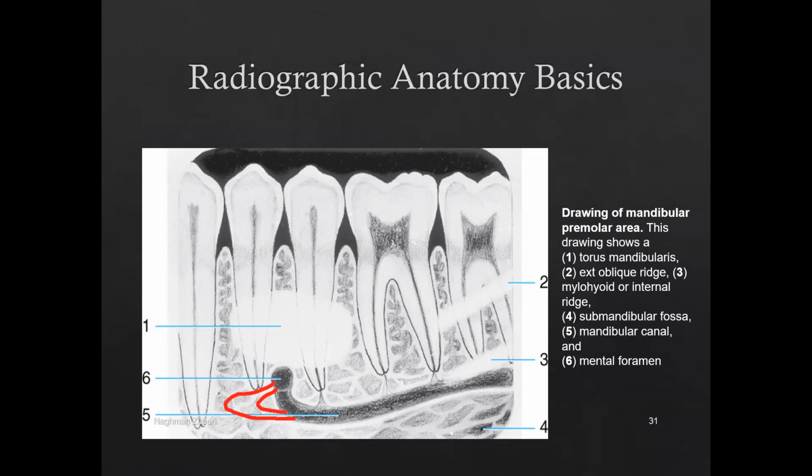So in case they ask you about the designing or placement of the implant, keep in mind that we will keep at least 5 millimeter anterior to this anterior loop. If it is straightforward, then 5 millimeter from the anterior border of the mental foramen. If you see the loop, this is the catch over here. So always check for the anterior loop.